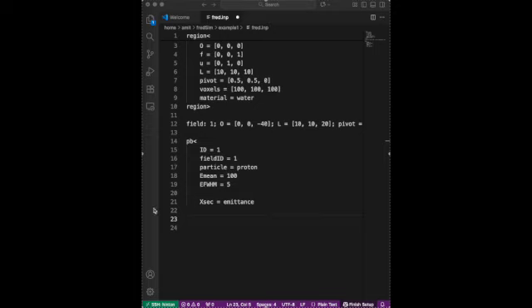Okay, let's move on to defining those. Let's simulate a pencil beam with no spot size. So twiss alpha, let's say zero. It's not diverging, not converging.